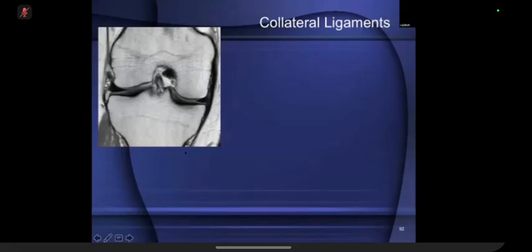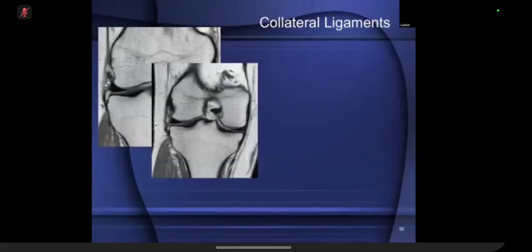So quite a few MR radiographers, if they've not been told, will cut off the lower attachment of the MCL. So when you're training them, make sure that they know that they have to go quite a long way down. Otherwise, you may miss an inferior abnormality of the medial collateral ligament attachment to the upper tibia. Practical point.